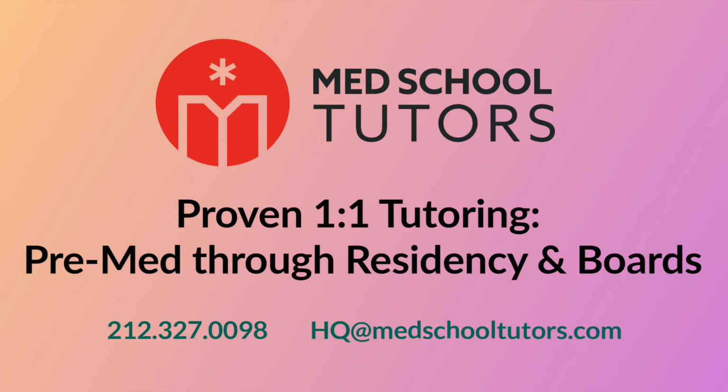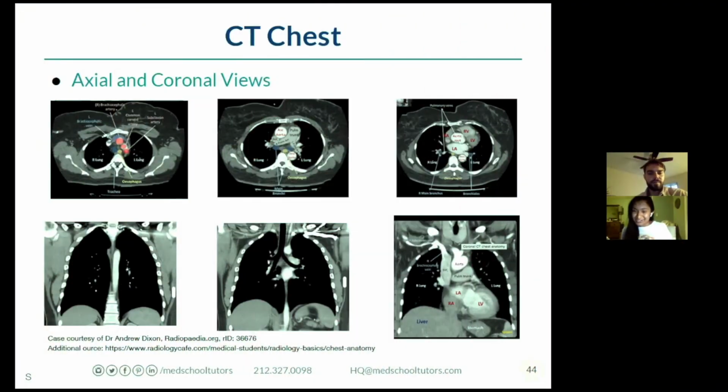So we have covered a lot of abdominal grounds because, again, like I said, there's a lot of organs in there to think about. But the other things to think about now are the chest and the anatomy there. Much of this is more detailed than you need to know, but just so you have a sense of what we're actually looking at, here we're looking at the highest level, almost at the very apex of the lungs.